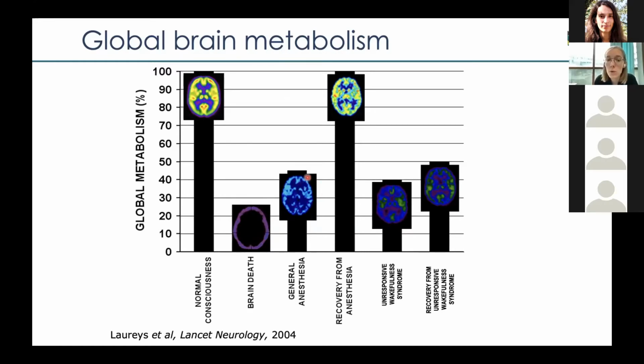Then when we look at the healthy subject under general anesthesia, you see that the glucose metabolism or glucose uptake is much lower than during normal wakefulness, so about half. But if the patient then recovers to full arousal and awareness, then we see that also the global glucose uptake is back to 100%.